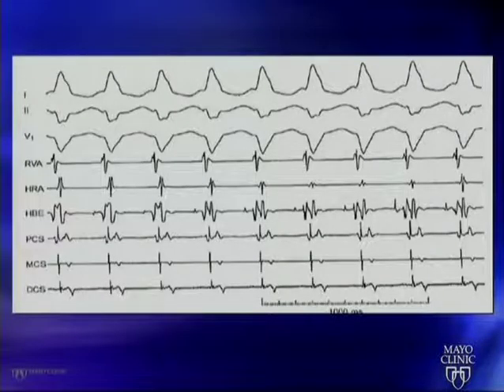What about this one? Look at this one now. A little harder. I'll give you a second to look through it. First, you look up at the EKG and you say wide complex tachycardia. If anybody can see P waves in there, you have really good eyes. They're really tough. I can't see anything that I would reliably say are P waves up on this.